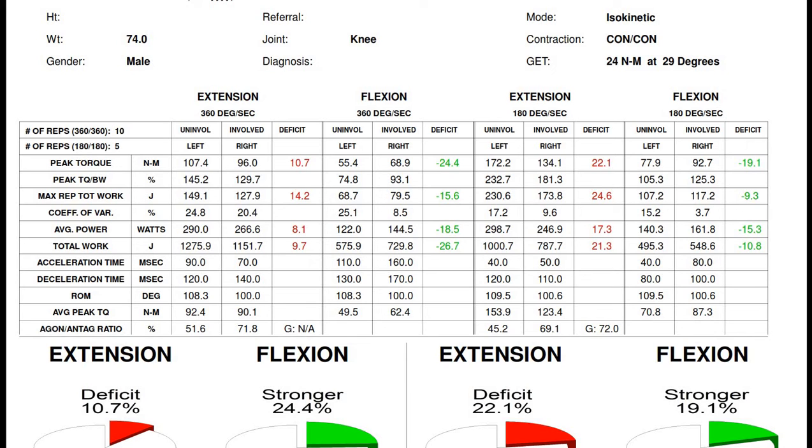So we're talking about degrees, so there's a small variation, but however there is a variation in the range of motion between limbs. Now this shouldn't occur unless, when setting up the away and towards limits, there is a significant difference between the two.